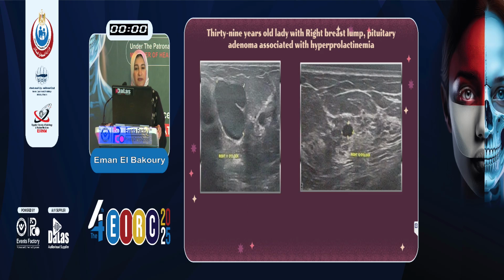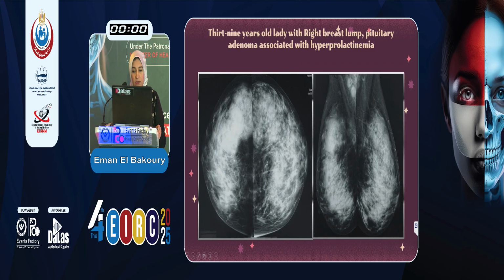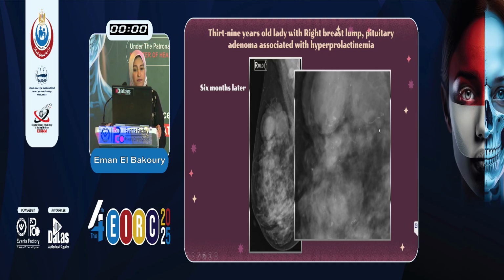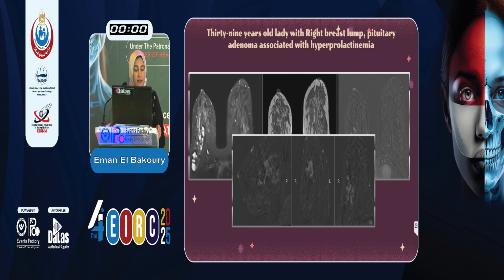So this is fibrocystic changes, and we can see the flecks of calcification between the cysts, and it was correlated to these obscured masses with round calcification. We assigned BI-RADS 3 and a 6-month follow-up. After this, the calcification had progressed, so we went for MRI, and here we can see the non-mass creeping between the cysts.